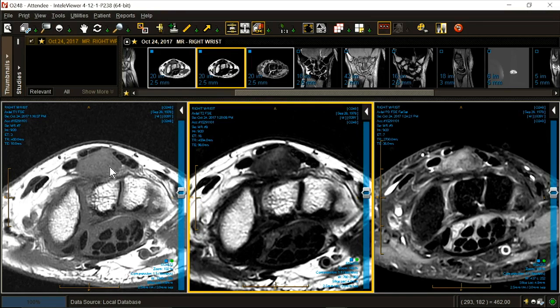Giant cell tumor of tendon sheath, GCTS. And that's how you come to the diagnosis. You might say, well, what about a fibroma? They're very rare. They're also very well encapsulated unless it's one of the more aggressive varieties. It's too respectful to be a fibrosarcoma. She's the wrong age and it's the wrong location for fibromatosis.